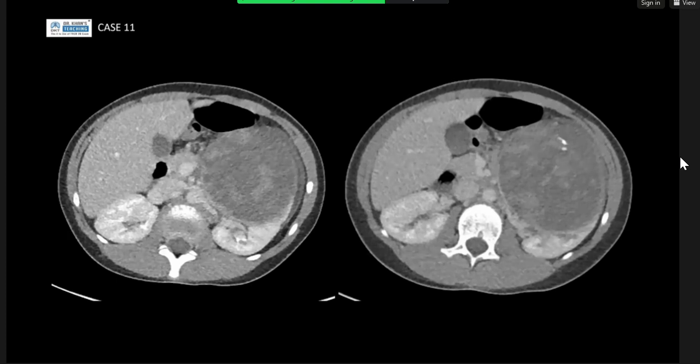Okay, so that's the kidney. What do you think of this appearance here? The parenchyma. I think that looks like a claw sign, yeah. So do you think this is still coming from the tail of the pancreas? No, I would like to retract the statement that it is coming from the pancreas. Mostly suprarenal. If it is renal, it can be a Wilms tumor, or a neuroblastoma may be my top differential diagnosis in this case.